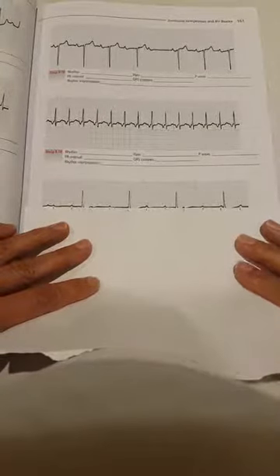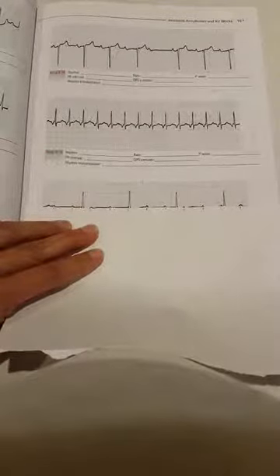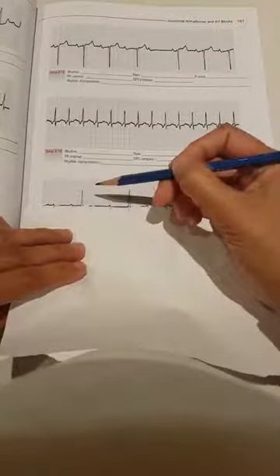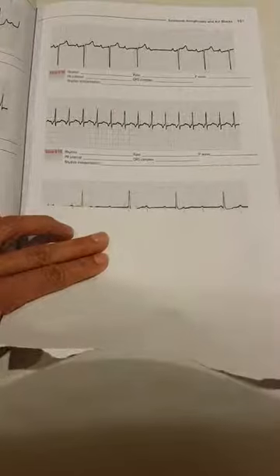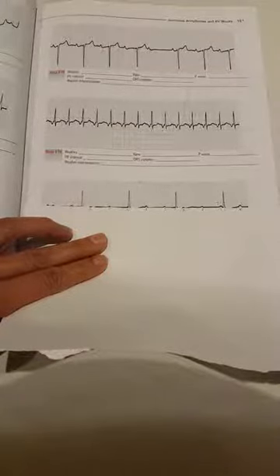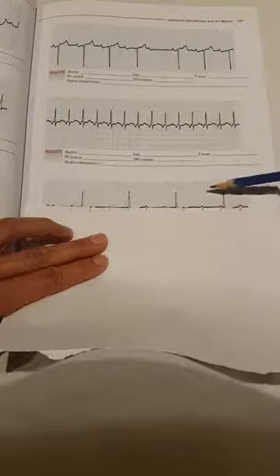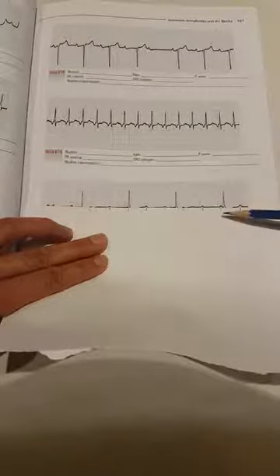and line up the P waves with the arrows, you'll quickly see the P's that we're maybe not so sure about, like this one, become prevalent. The one that's just at the base of the QRS complex here becomes a little more prevalent with the arrow. And I think the other ones we did see. Okay, but what you can tell here is that the R to R interval is regular, but so is the P to P. And it seems that there's dissociation between the ventricle and the atrium.